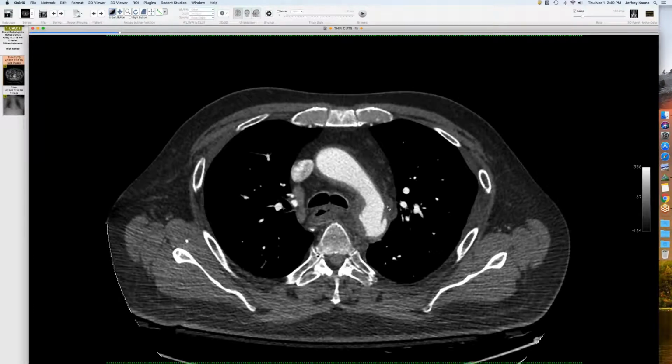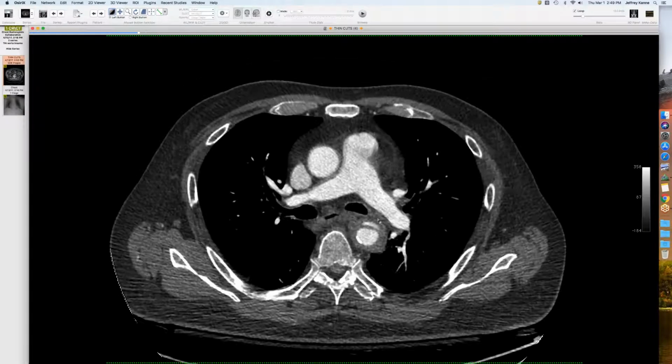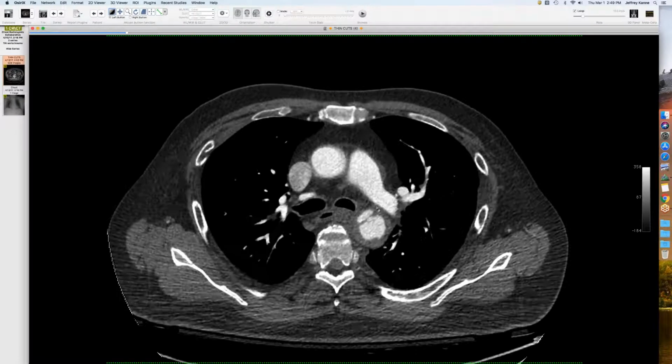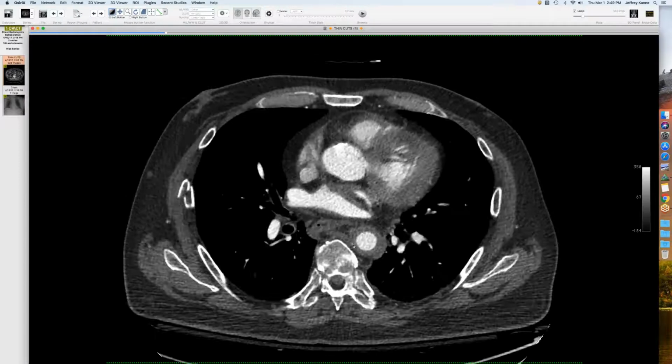But one thing that's not addressed is what they do with an intramural hematoma. But they ended up stenting him. He went straight to the OR. They stented this, and then they explored his abdomen and repaired some minor lacerations. But I thought it was kind of cool, just this extensive one.